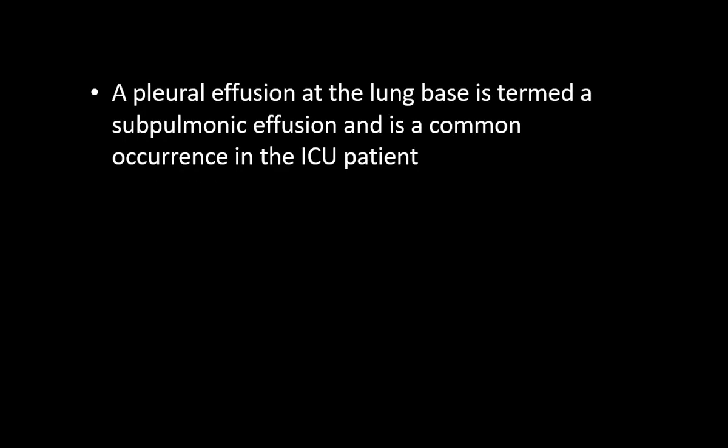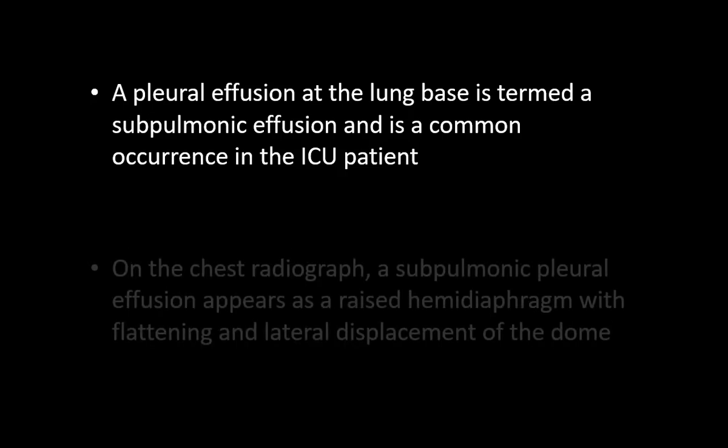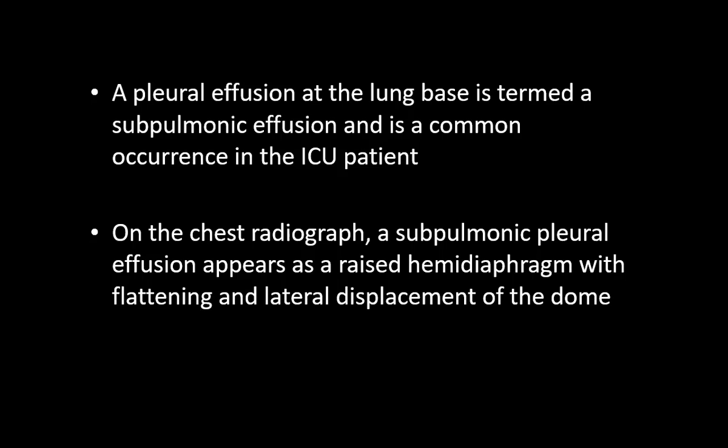This is a common finding, subpulmonic effusion, which is pleural effusion at the lung base, which we see commonly in our ICU patients. It could be because of atelectasis, pneumonia, or other etiologies. On the chest X-ray, a subpulmonic pleural effusion appears as a raised hemidiaphragm with flattening and lateral displacement of the dome.